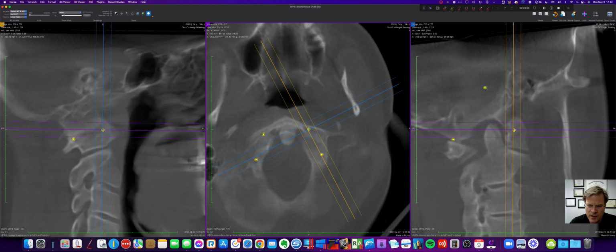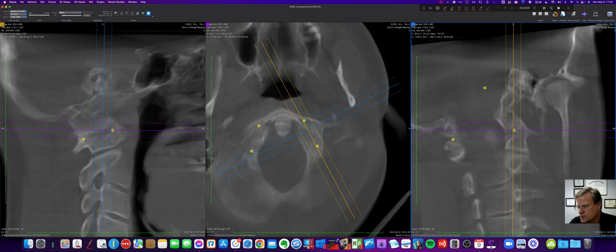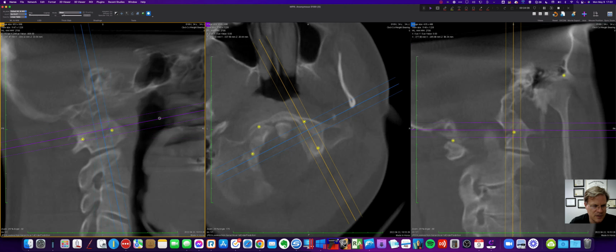Good. Now this is way up in the front, so let's back it up. Okay, hard to see. Looks like maybe an AS. Let's tilt this like Dr. Blair would. Oh, that's looking a little closer. Let's thin it up.